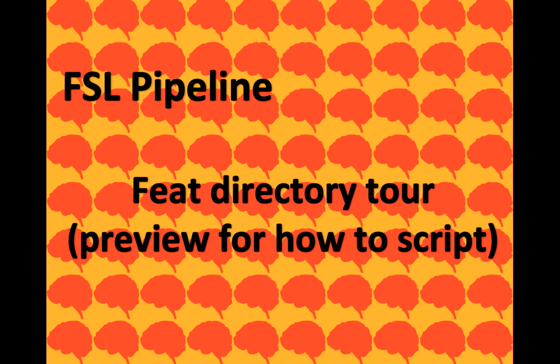So we're going to go on a little tour. If you go to this link, I'll put a copy of the link in the information box. It has a lot of information about the files. It has this kind of setup. You can see the design.fsf. That's the big one. That's everything that's in the Feat GUI right there. And this is picking out the really important ones, and more importantly, it's helping you explain where certain things come from. We won't have this directory yet, and we won't have this because we didn't run TS plots, but the rest of it we did.